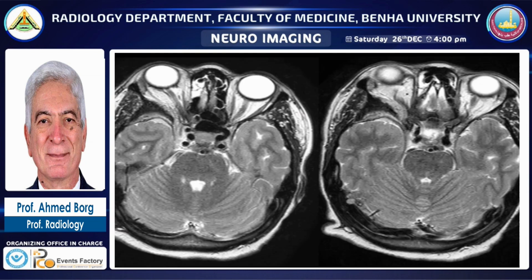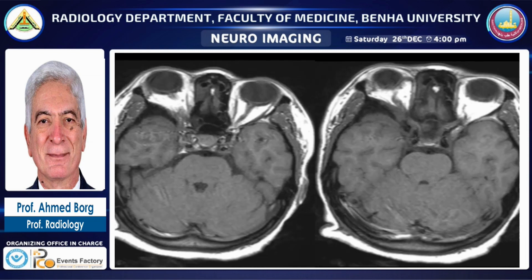Next is a 39-year-old female. This is T2 weighted image. And here is, what is this? Can you guess what this is? Compare with the other side.